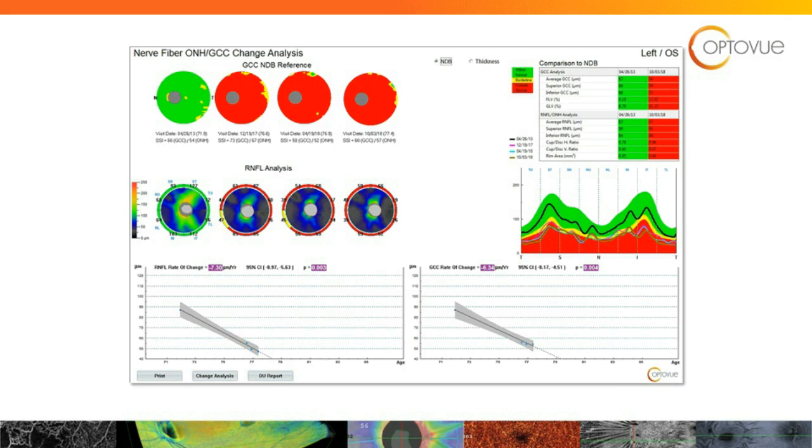If you're talking about that gray arc on the other section that's measuring macular thickness, that is important to me, but it means something different. But I think what you mean is a red arc. If you're seeing the red arc within the ganglion cell complex, that would be an important thing to red flag, and I would have them back for subsequent glaucoma testing.